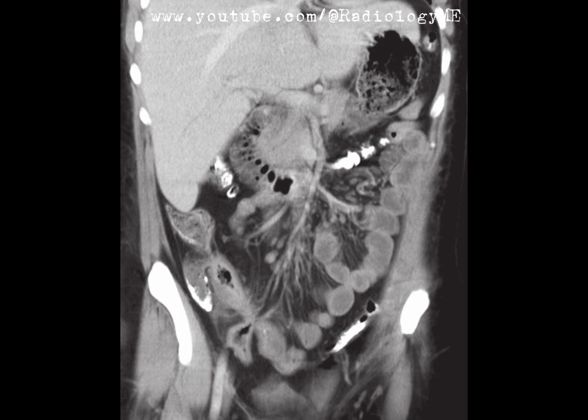So the next step in managing this case would be to consult with the gastroenterology team. They'll likely want to confirm this diagnosis with endoscopic biopsy of the terminal ileum. Cross-sectional imaging like MRI can be helpful to further delineate the fistula tracts, but endoscopic inspection and biopsy remain key here.